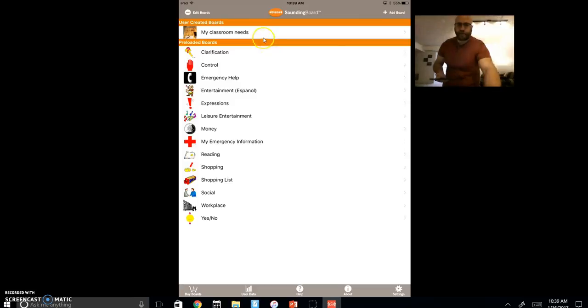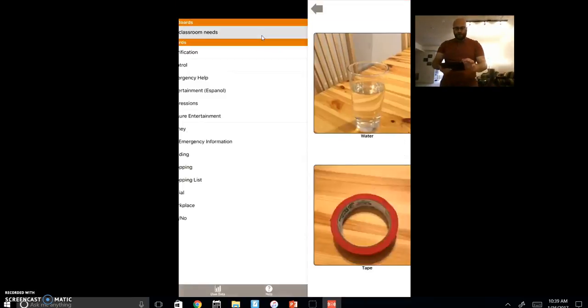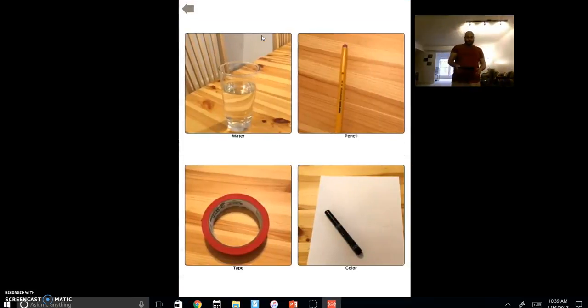When you go to the top, you've got your user created boards. You click on that. And that's the board I just created. So whenever I click on one of these pictures now, I am thirsty. Could I get a drink of water? Could I borrow a pencil, please? Do you have any tape that I could use, please? Can I please color?